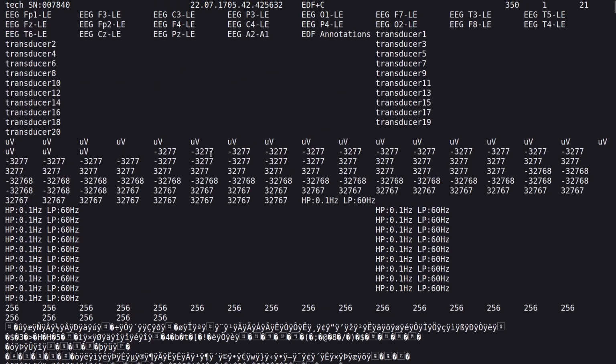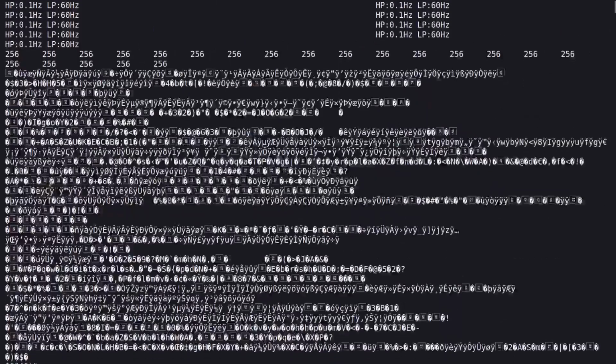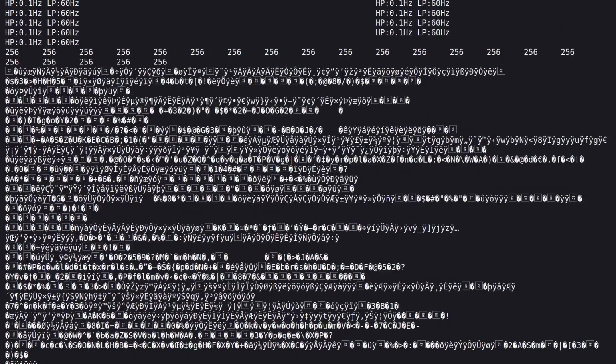The format is a bit weird because there's a bunch of tabs and stuff, but what you need to understand is that this part from top to bottom is the header, and right after that, this garbled mess, which is literal bytes of information, is the data. So this is each of the data points that we are recording for the many signals that we have, and then it goes on and on.